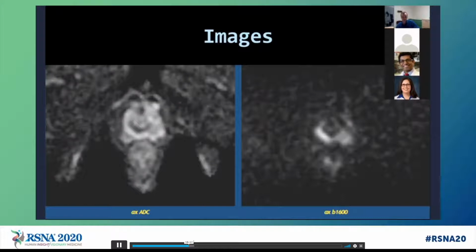And we didn't say the type of biopsy, actually, but I'm assuming that this was a randomized transrectal biopsy. At this level, we're quite low down in the apex, so it's correct, this is an easy spot to miss. Yeah, so we may well not have sampled that with a systematic biopsy.